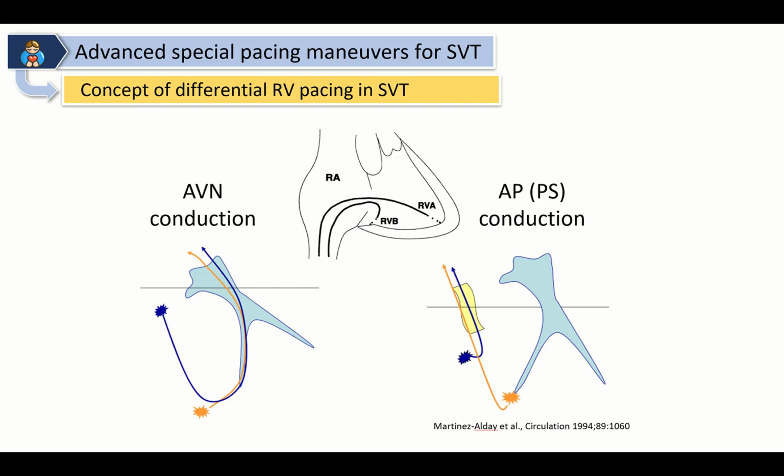And this is the main concept in case of accessory pathway at the right side. Let's see stim to A. When you start basal pacing, stim to A is shorter than stim to A during apical pacing. Why? Because you are very close during basal pacing to the accessory pathway.